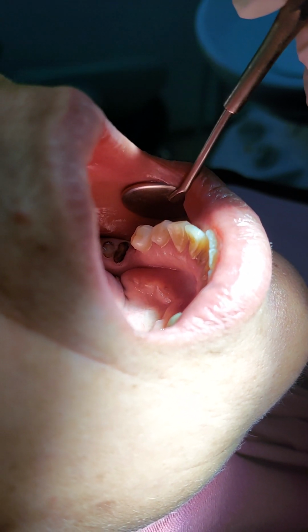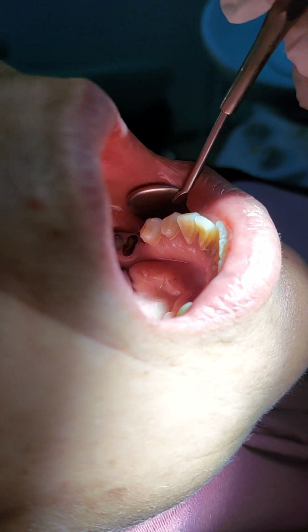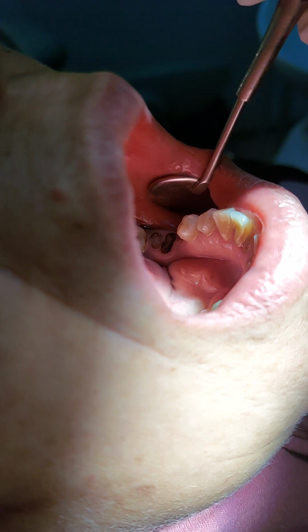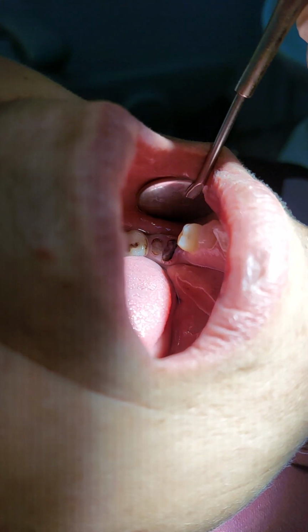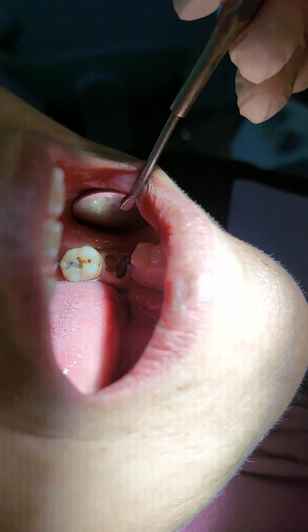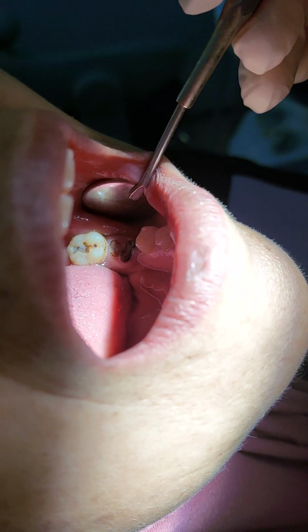When there is a missing tooth, the neighbouring teeth move and tilt to compensate for the space. When does this happen? Usually this happens when the extraction was very early in the age of the patient. So this was the 6 that was extracted. So we had the tooth extracted, then the 7 shifted mesially, and this is what you see as roots now.